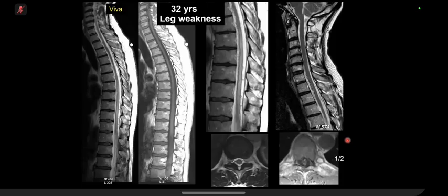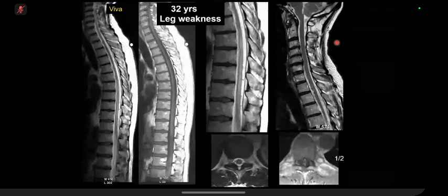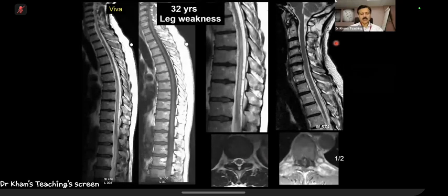These appear to be vascular. On the axial images, you can see tiny low signal dots circumferentially around the cord itself. And in the post contrast, there is some enhancement more peripherally around the cord. I think this is a dural arteriovenous fistula. Excellent, well done.